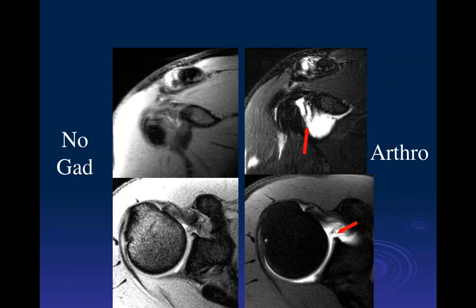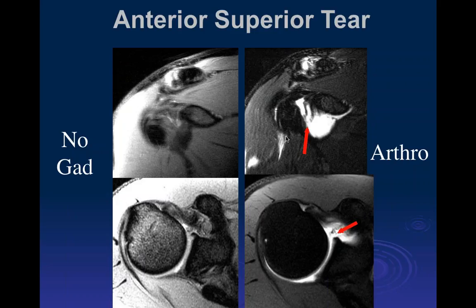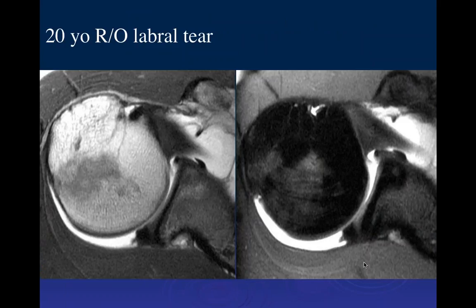In this case, it looks like this contrast structure is extending along a longitudinal structure, and this was actually a superior tear of the labrum in this location, where it comes out. How do you distinguish that from the sublabral foramen? And it looks like it's anterior and up, so it must be. But because on the images you can see that the contrast is actually going into the structure of the labrum itself, and you don't see that with the sublabral foramen. Okay.